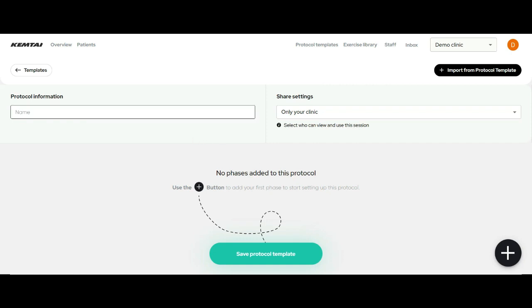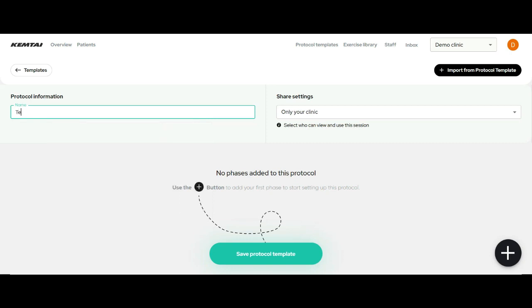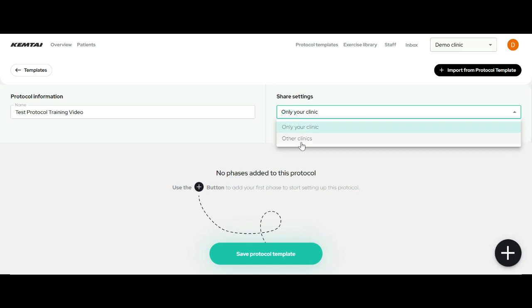The first step for creating a new protocol is to create a protocol name. Let's call this Test Protocol Training Video. We can share this protocol with other clinics or keep the protocol private, but remember that all the clinicians in your clinic will be able to view this protocol.